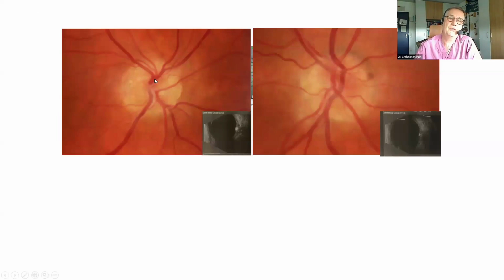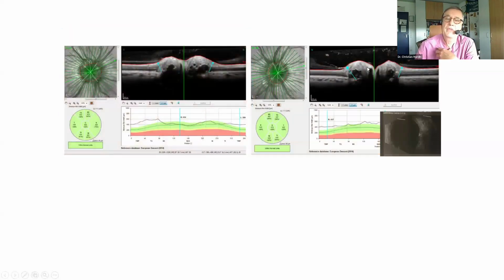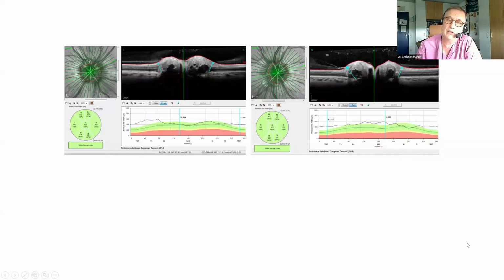When you look at the optic disc, you appreciate the drusen. Of course, you can do an echography and you see the highly reflective area in the B scan. When you look at these optic discs with OCT, with rim width measurements for example, the rim is ridiculously thickened beyond the normal range. In elderly patients, not in young patients where drusen are deeper, you will encounter superficial drusen with a dark center and a little hyper-reflective surface. Then the diagnosis is rather easy.